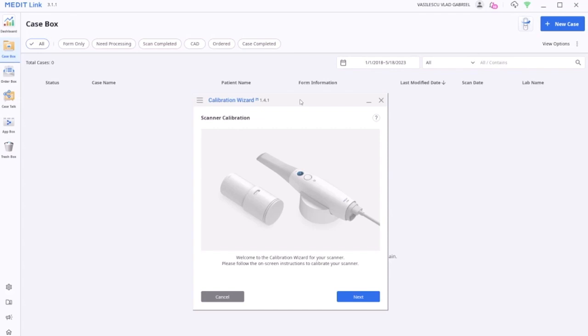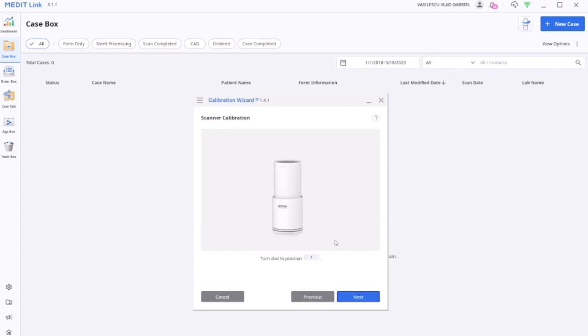For this we have a special device, as you see in the picture on the left side. So this tip is removed, and instead of it, this calibration device is mounted after we remove the end tip. So this is the calibration device.